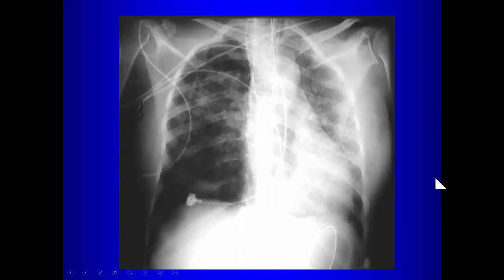Now, pneumothorax on a portable chest x-ray can be hard to see, but when the patient is supine, the air can collect in the costophrenic angle. So we call this the deep sulcus sign. When there's asymmetry to the costophrenic angles and one sulcus is deeper than the other, that's because there's air in here, and that can be a sign of a pneumothorax on a portable chest radiograph.